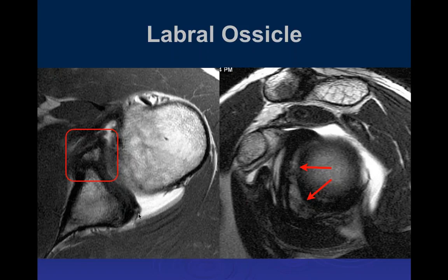So bench pressing is important in the training for pitchers, and if they don't do it properly and they allow their shoulders to go too far down in the process, and they like to lift more weight, they kind of bounce their shoulders off the posterior labrum, in which case it's common to get posterior labral tears. I think we'll see some more of these in Major League Baseball pitchers, but that's a common injury. So this could potentially be an acquired lesion, though this shape really looks more like a mild congenital anomaly.